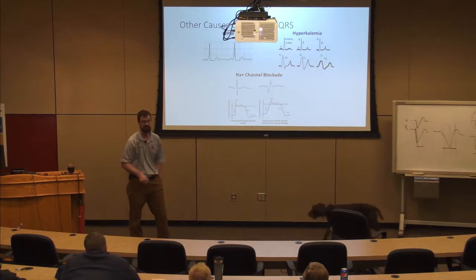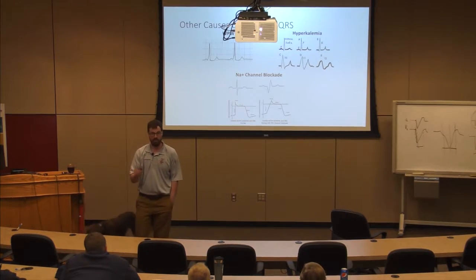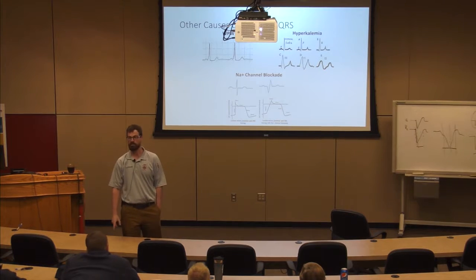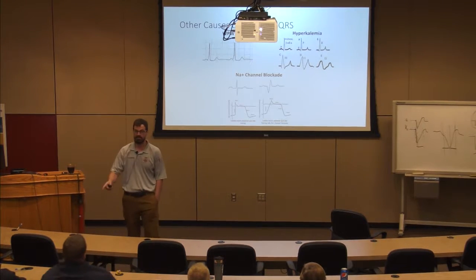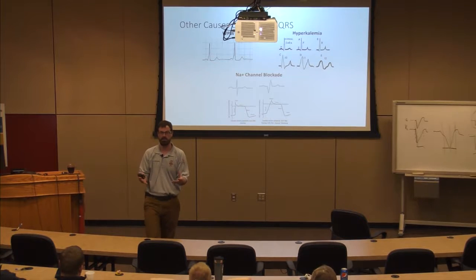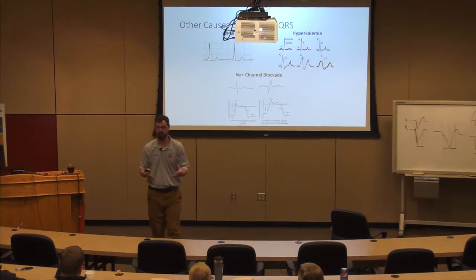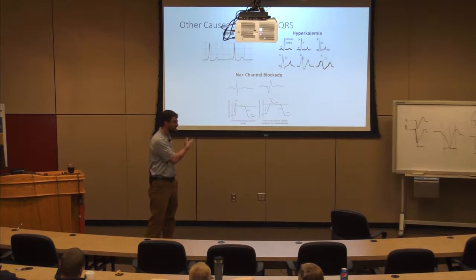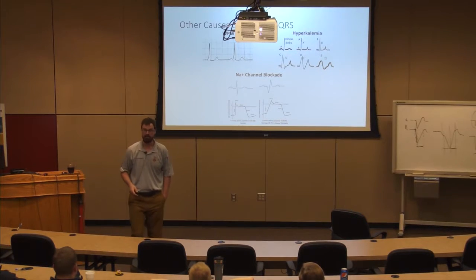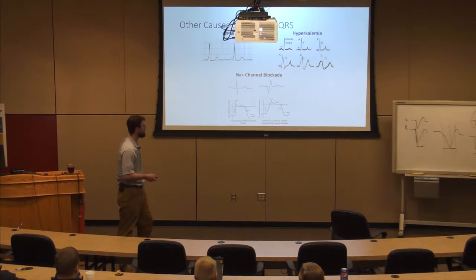Everybody sees this and they say, oh, shit, looks idioventricular, right? Beware of showing up and calling something idioventricular. Because what's idioventricular? It's this junk box of, I don't know what the hell it is. So I just put all this slow, wide shit into one box and I call it idioventricular, right? So be wary of calling things idioventricular. Think hyperkalemia, okay? Think digitoxicity. There's a number of different things that can do it.